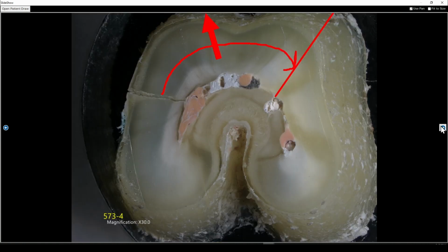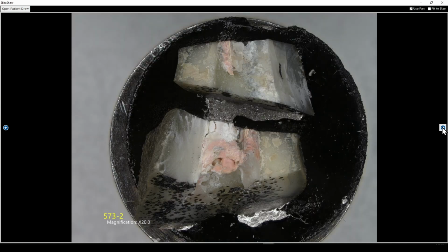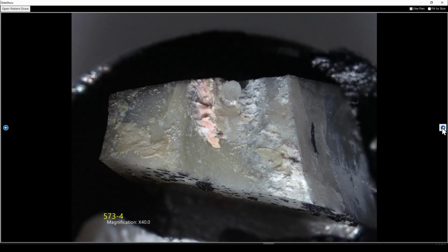And then we subjected it to electron microscopy, and I wanted to look at the canal walls along the fracture line just to see what the biofilm looked like along a fracture line. So I cut into the root where you see the line and fractured that piece off, and then we could look at the biofilm along the fracture line and get a pretty good look at what that biofilm actually looked like and see if any of it actually went into the canal.